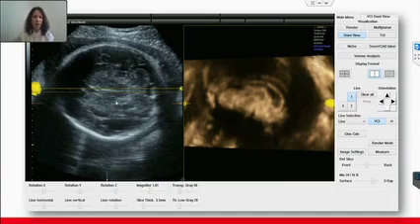And this is a pretty thin line. You can see here this slice thickness is 3.1 millimeters. And you can see the coronal plane. This is a calculated plane. You can see very nicely the corpus callosum, the cavum septum pellucidum, and the vermis here with the VCI-C.